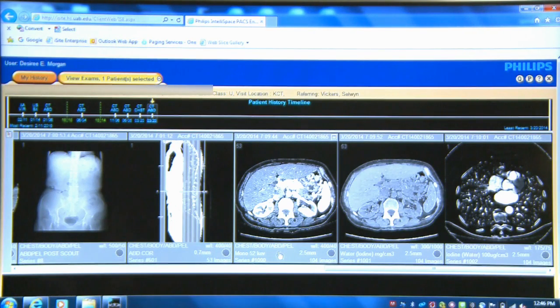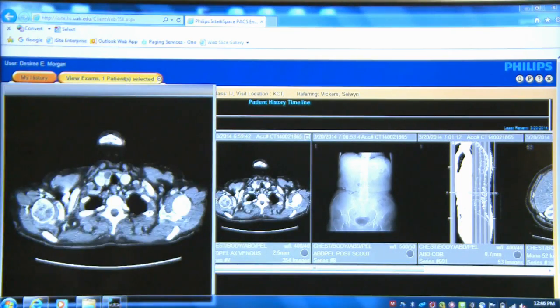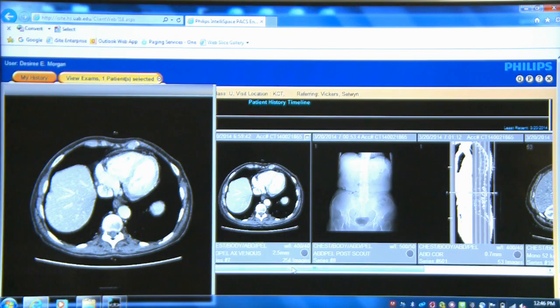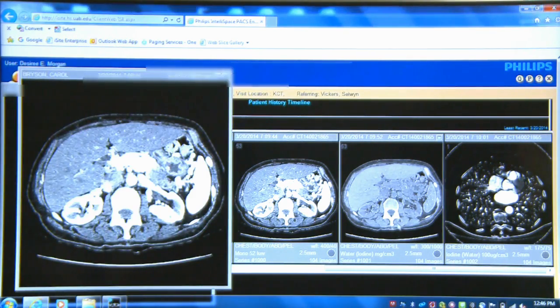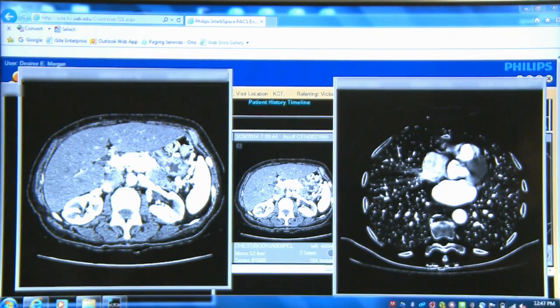So now at the end of our image rack in PACS, we see the special dual energy images. And if you want to look at those just like you would a portal venous phase, so you guys look at these every day, paging through on PACS, the same thing happens for the dual energy images. So I'll move over here. We have the 52 keV image, the water image, and the iodine image, and these are called basis pairs. So we can just open up the 52 keV and the iodine image, and you can do this together side by side on your PACS or one at a time.